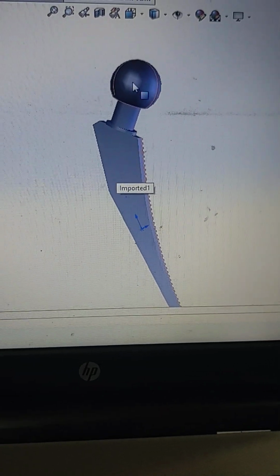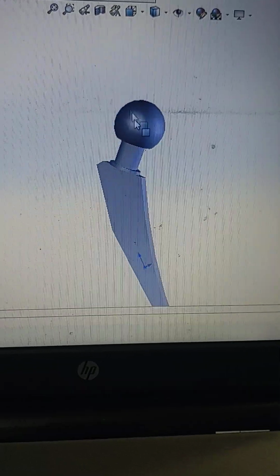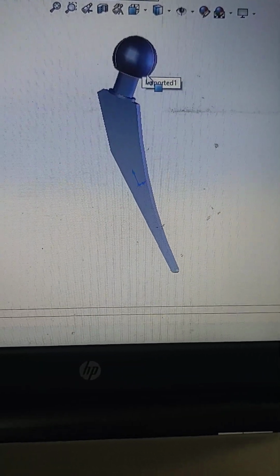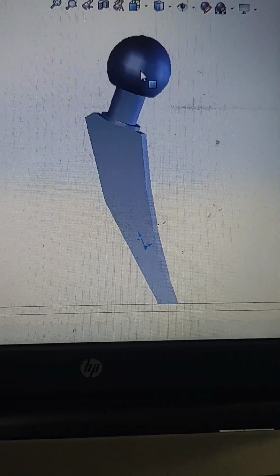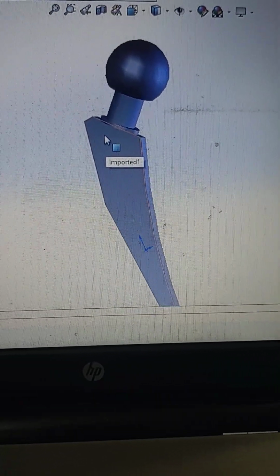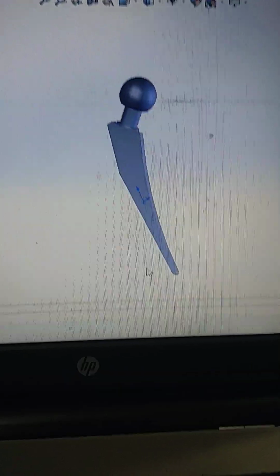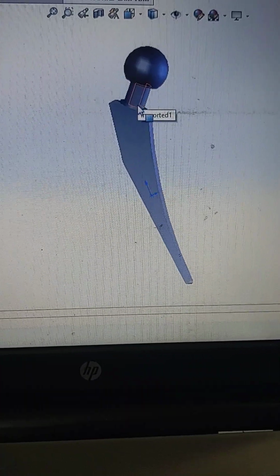Furthermore, as I previously said, this is the ball, made up of biomaterial, which I will discuss in a minute. So this will insert in the hip. The surgeon removes some part of the bone, and this will be inserted in the hip. This femoral stem will insert in the femur bone, in the thigh bone, and this will be fixed inside the human body.